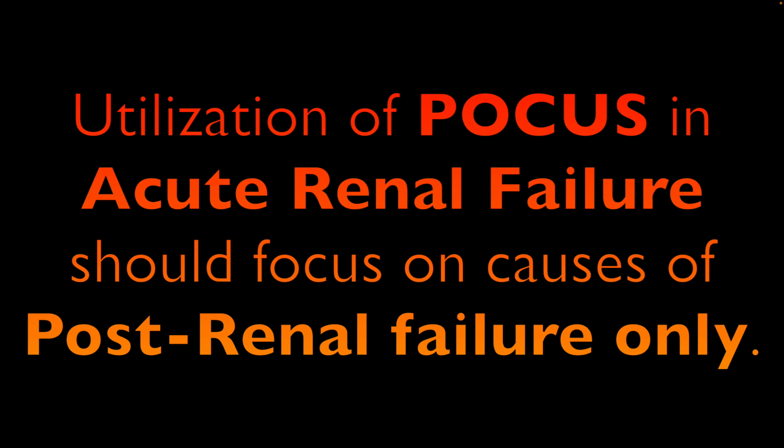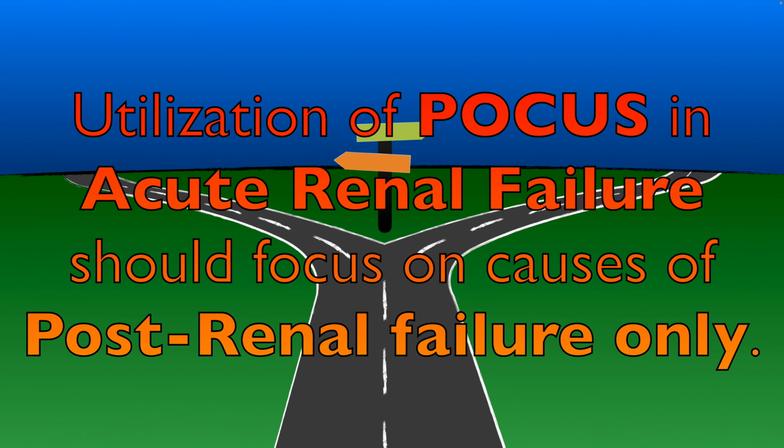Remember, when we're doing clinical ultrasound, this is a study where we have very focused binary questions that we're trying to answer, and we are not trying to do that consultative comprehensive exam. Instead, we are very focused. And so I want you to remember that. How I look at it is that using ultrasound creates a fork in the road. Either I go down one path or the other. And in this case, do I want to admit that patient to a medical team, or do I need to get them to a surgical team to relieve any type of obstruction that may exist?